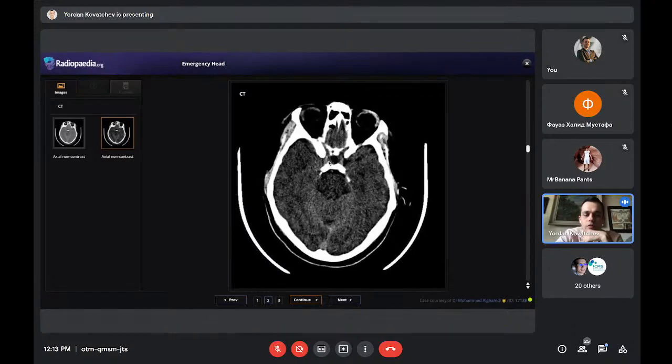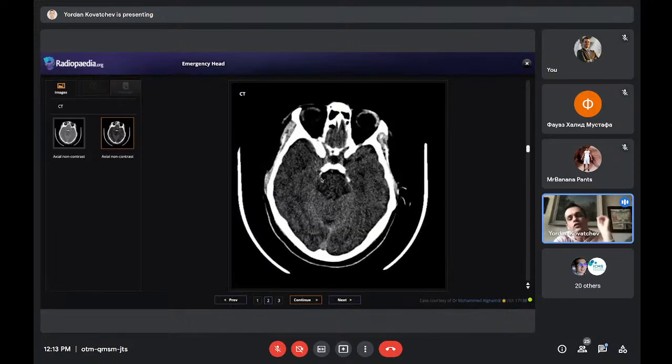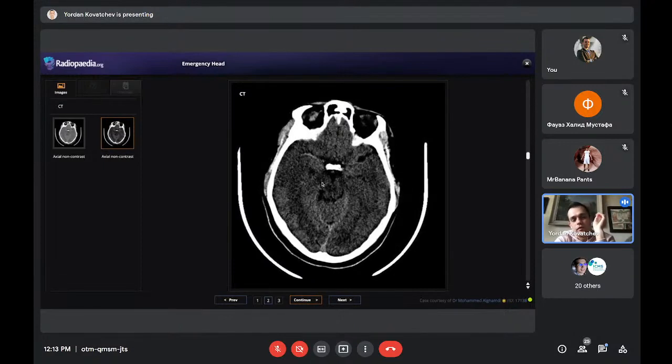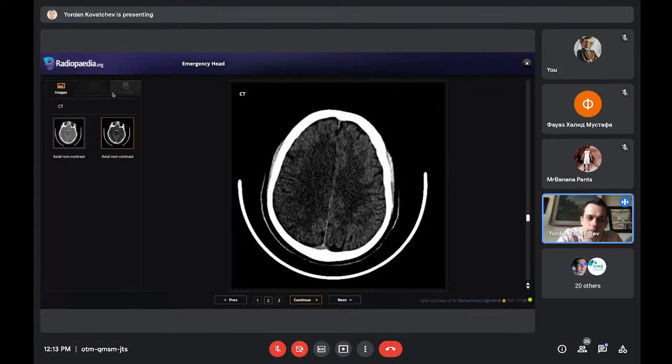And then on the right side, you see the carotid artery turning into the MCA, and it's more hyperdense than on the left side. It's not so obvious as in the previous patient, but it seems that way. And in this patient, we will definitely do a CT angiogram. Let's see if I got it right. Yes. Hyperdense MCA.